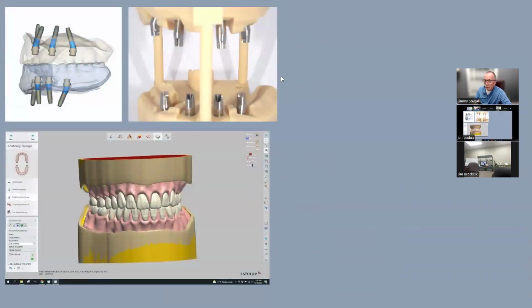So in the Conus workflow, right, it's all got to be customized. But we have those dentures, right? We have the data of the dentures. It's fully aligned. So all we do is send those denture scans along with our order for Conus, and they will get the parallelism right and fit it into the parameters of the patient's denture. But sometimes it's even worth the effort of making a couple of prototype dentures if the patient doesn't have any dentures.